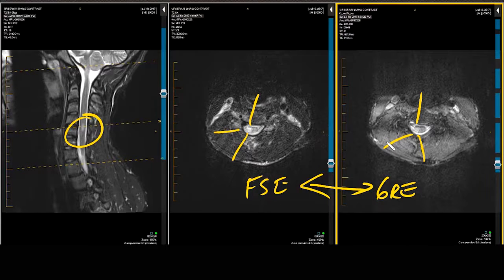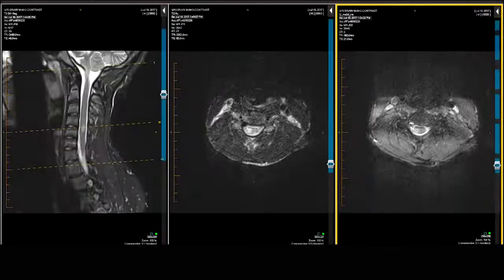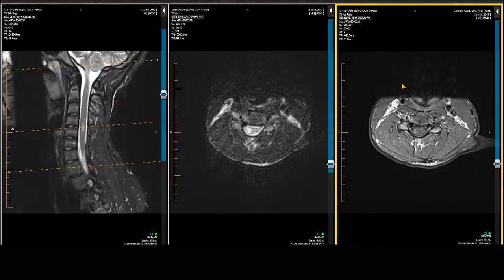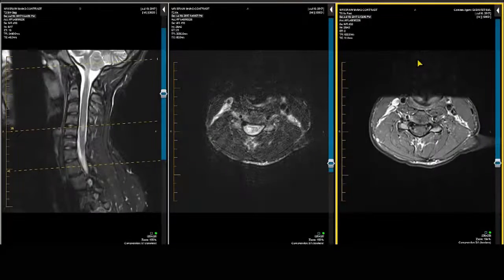If we pull down the post-gadolinium enhanced scan, we are actually able to see quite nicely, better on the axial scan than on the sagittal scan, that this is indeed a demyelinating plaque that's showing contrast enhancement. So it's in the periphery of the spinal cord, not centrally, but in the periphery of the spinal cord, you see that area of active demyelination demonstrated by gadolinium enhancement.